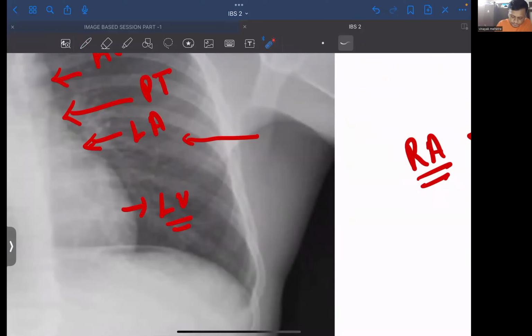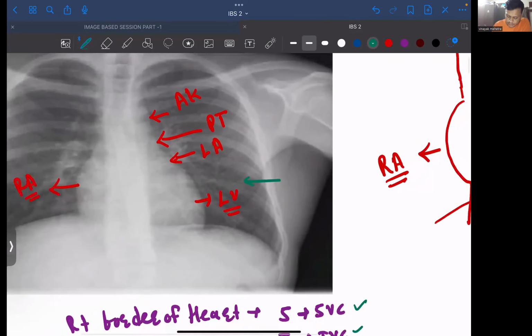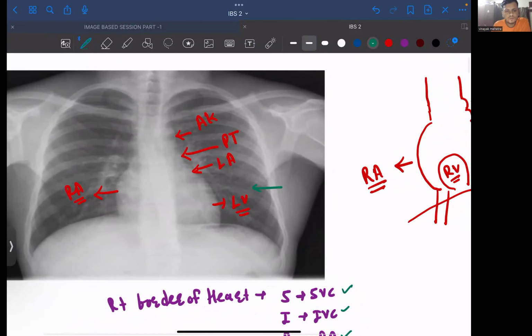Like this. Which is this rib? Okay. Now take a look. What do you think? Which is this rib? Anyone? Can take a wild guess? No? I will make it clear.